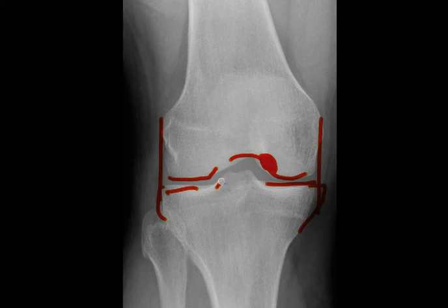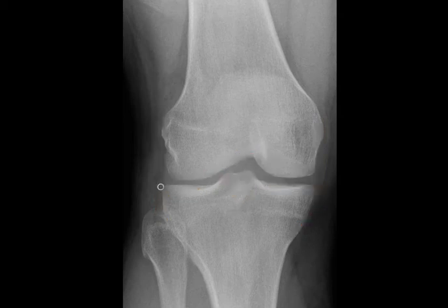The intercondylar eminence should be intact. A fracture in this location is indicative of a cruciate ligament injury. Also look at the lateral border of the lateral tibial condyle. This should be sharply defined and smooth. No fragments of bone seen in this area. If you do see a fragment of the bone, that is classic for a Segond fracture.